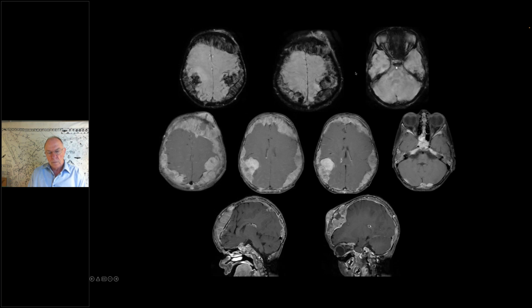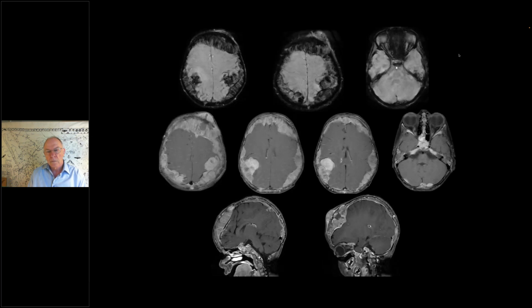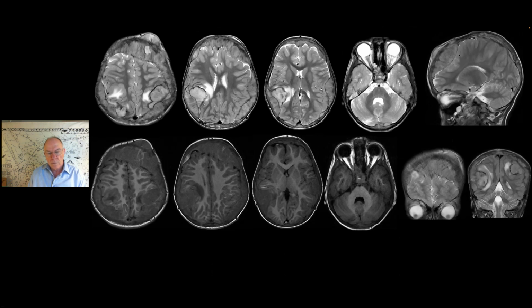The only thing against that... Yeah. I think the concern raised was extramedullary hematopoiesis because the lesions are more hyperintense than what we usually see in extramedullary hematopoiesis, which is uniformly dark on T2-weighted sequences. But here, as you can see, it is not dark. It is more of a hyperintense heterogeneous appearance, and the lesions are more aggressive. And I'm concerned of mets in the lungs as well. I'm very concerned. I've not reported a CT chest for many years, but that lung doesn't look correct either.